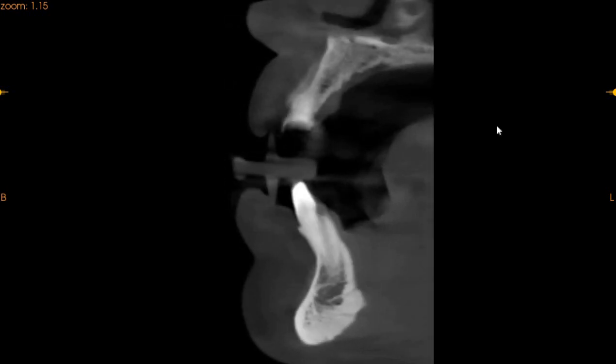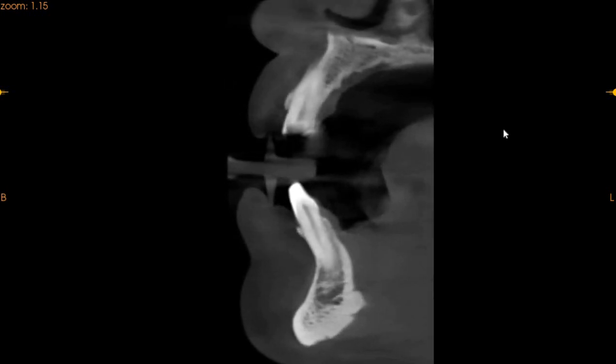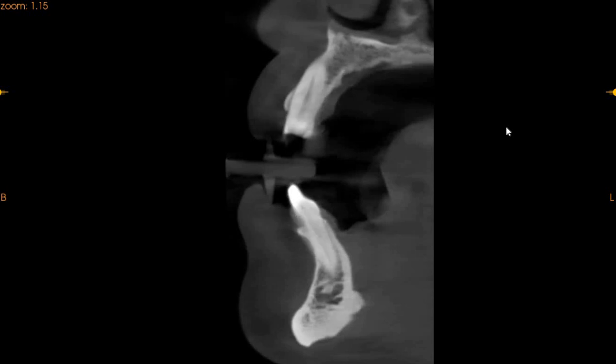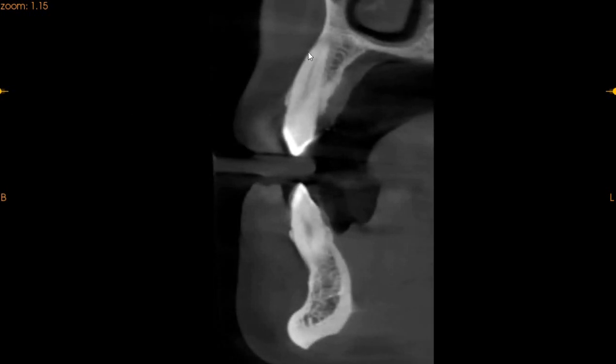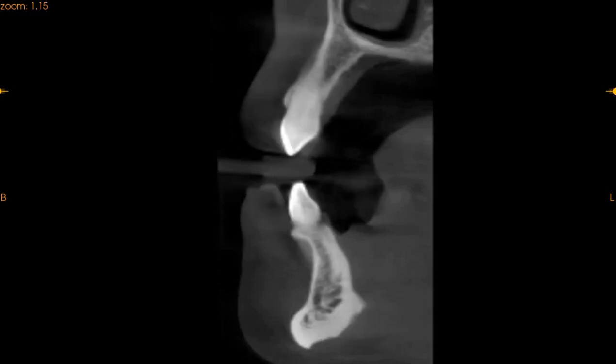This is the lateral incisor. The lateral incisor is also significantly, it is grossly carious. We don't see any significant crown structure. We also cannot see any periapical radiolucency. Moving to the canine, it appears to be doing very well. No periapical radiolucency, no carious lesions can be detected.